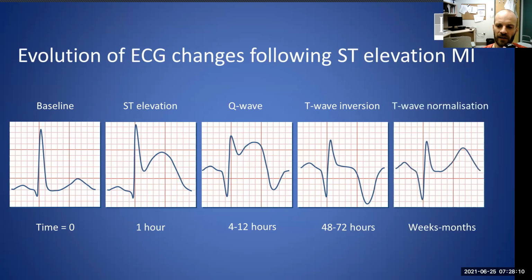Finally, weeks to months later, things will end up where you remain with a Q wave, but the ST segments will most of the time normalize, and the T waves will come back up again as well.